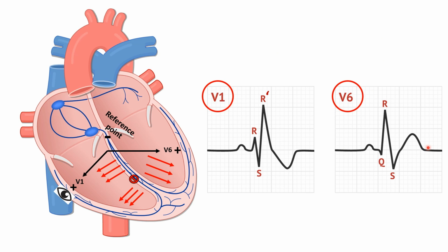So alteration in one ventricle's electrical activity can impact the overall electrical activity of the heart and even the other ventricle. The electrical activity of the right ventricle in this case is altered, but this can even impact the left ventricle, leading to this wide slurred S wave. But remember, the conduction system is all interconnected.